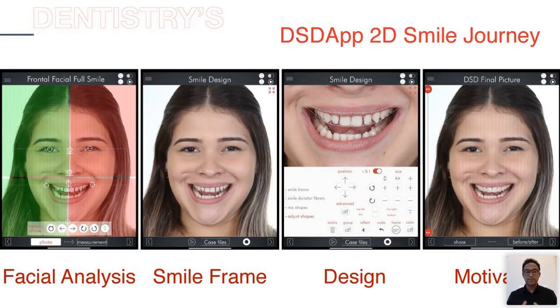So how does it work? How does the DSDApp 2D smile design journey work? You take one frontal facial picture of the patient smiling. And by doing that, the app will automatically help you analyze the patient's facial structures. After you do the facial analysis, you then create this smile frame, and then you design, and then you show the patient the before and after, this facially driven smile design, and motivate the patient and get a higher case acceptance rate.